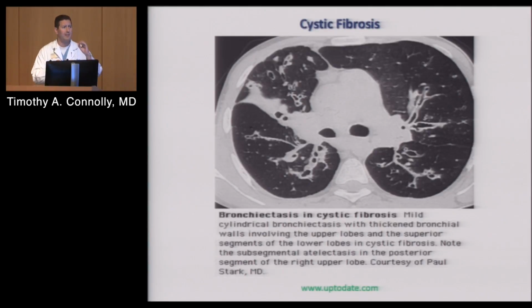And so when we talk about bronchiectasis, we're talking about airways that, rather than going from big to medium to small in tapering manner, because of chronic inflammation, they dilate. Once they dilate and the structure is altered, they never go back to normal. When that happens, the ability to clear mucus is less efficient. So you end up with lots of mucus problems, lots of plugging from mucus, lots of infections because of that airway getting gunked up. So these are all bronchiectatic segments. It should look like this. It shouldn't ever look like that far out, that peripherally. And so CF is the most classic example.